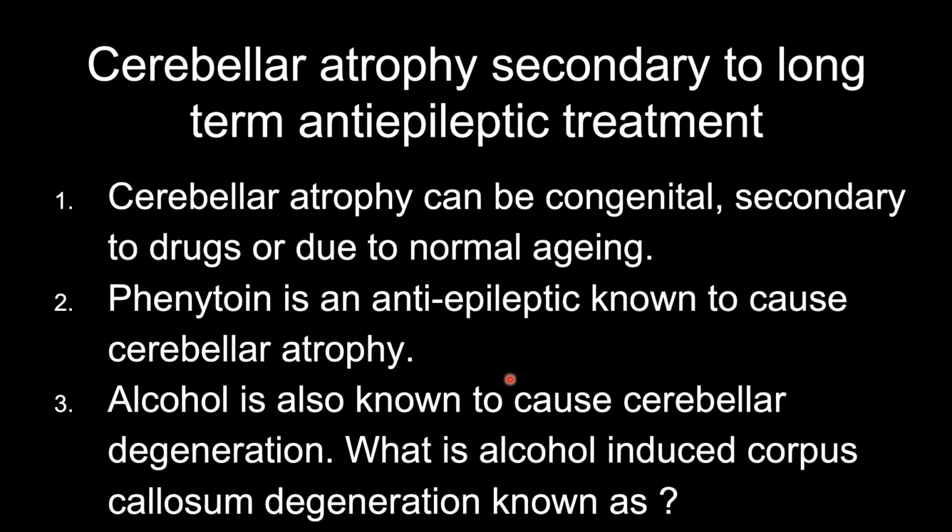So I have a question for you guys here. What is alcohol-induced corpus callosum degeneration known as? You can type in your answers in the comment section and I'll reply to those with the correct answer. A hint here is that it's a 3-letter word and it starts with an M.